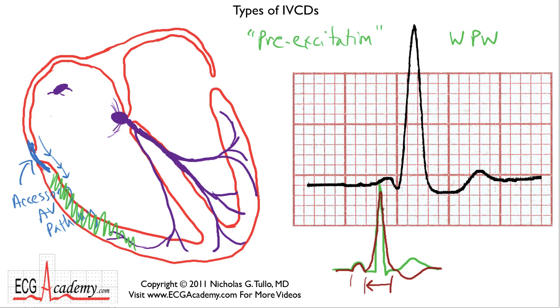So here, this EKG is a typical example of pre-excitation. If you measure back from here, you can see the PR interval is short. It's only maybe 100 milliseconds. The QRS complex is wide. It's just over 120, about 130 milliseconds here. And the upstroke is somewhat slurred. See, it's not a sharp rapid change in voltage over time. It's a very slurred upstroke.